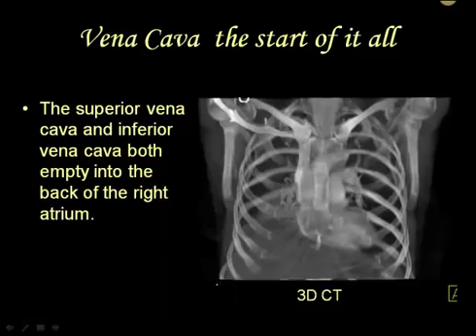All right. Now, getting back a little bit into the anatomy of all of this, we've talked about this before, but it never slows me down from talking about it again, which is the flow of the heart. The image that you're seeing right there is a 3D CT. In essence, this is a volume rendering of a CT scan.